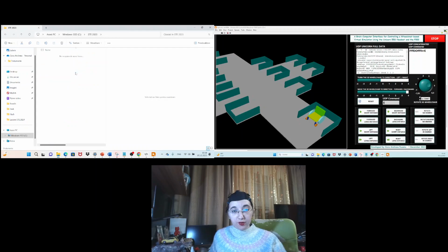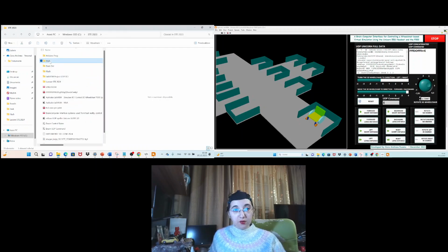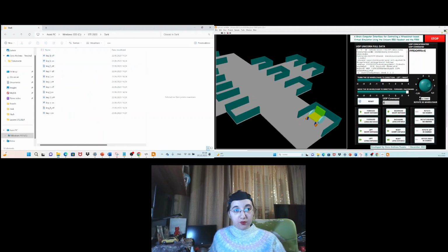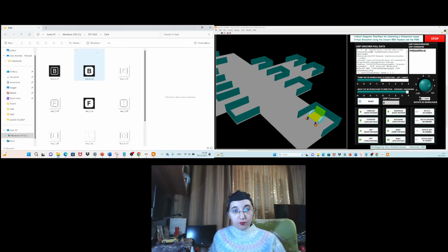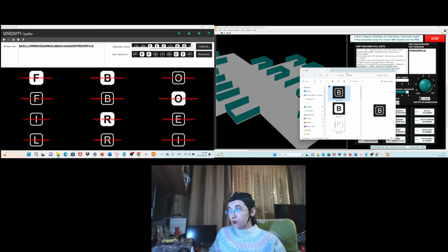These are the flashing items based on human faces, and I'm interested in 2 dark items. This one. So let's see.